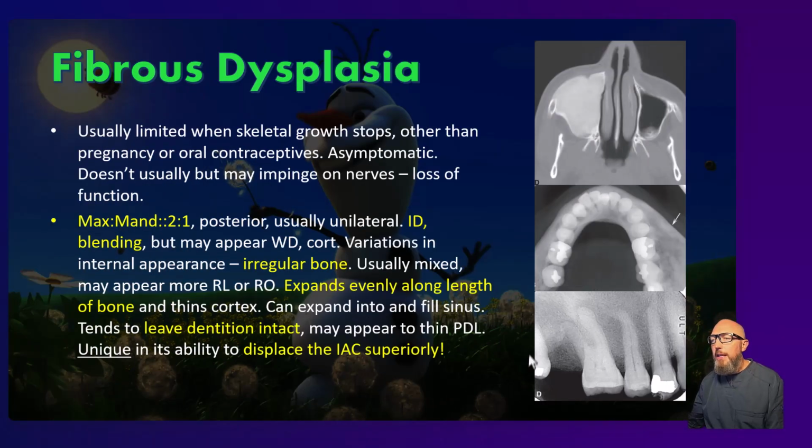All right, so one of the classic appearances is filling up the maxillary sinus with a bony type appearance, just a moderate gray. Maybe you wouldn't describe that as ground glass, but when you've been around pathology long enough and you've seen these fibrous dysplasia lesions that look this moderate gray, we'll describe that as ground glass. Down here is probably more a typical ground glass, which is the prototypical description of fibrous dysplasia.